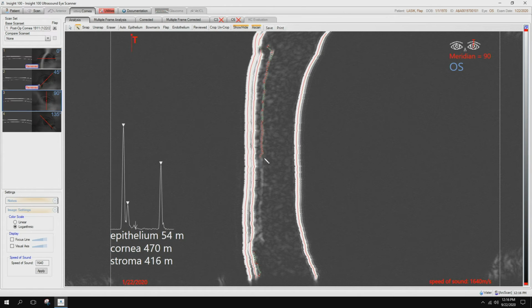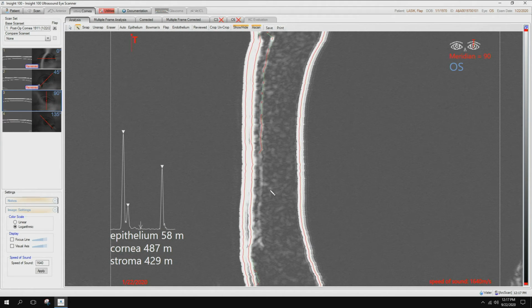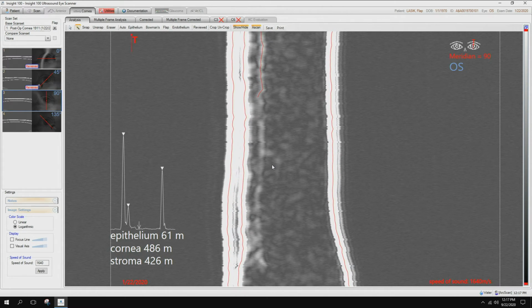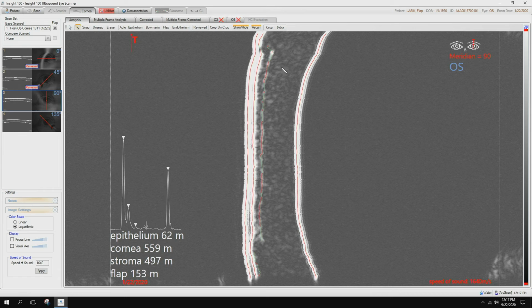If you're having a difficult time seeing the flap, right mouse, hold down, change brightness, contrast, etc., to really emphasize that anatomical structure, in this case, the flap. Mouse wheel, I can zoom in, hold the mouse wheel down, I can pan. Back to that. Now let's finish our work. Simply draw down, all the way down. Yes, this takes a little bit of practice. Practice makes perfect. You want those perfect outcomes. This is the effort that we have to go through.